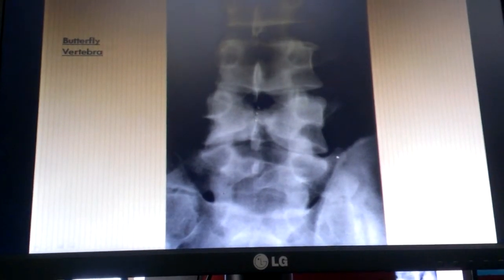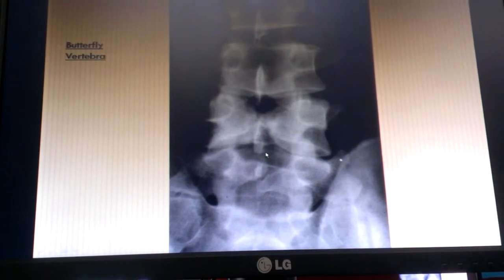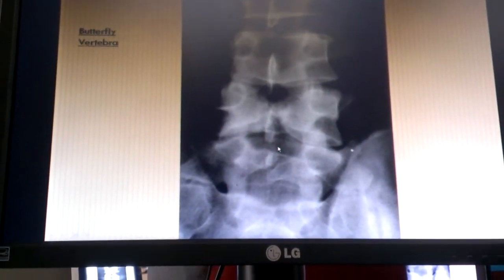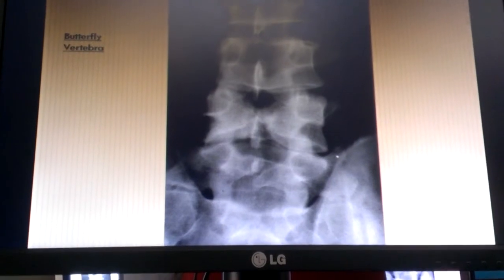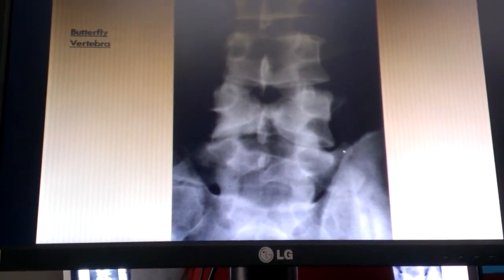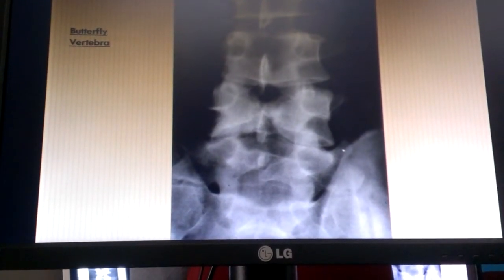And so this is where you've got nuclear material in the disc here, nuclear material in the disc here, and there's a connection between those two centers of nuclear material. And that connection is through the vertebral body, right? So that separated out the vertebral body into respective right and left halves, but all the posterior elements are still the same, right?